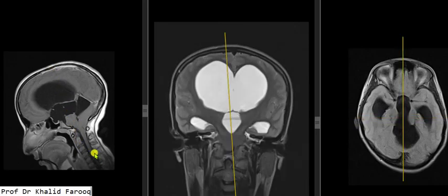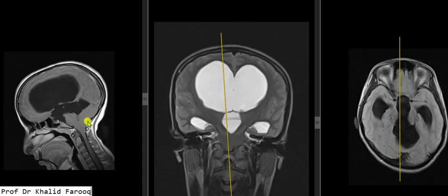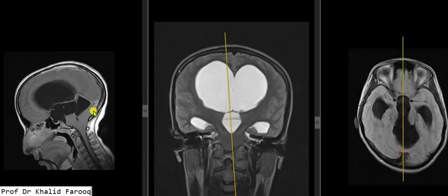We have placed it in Arnold Chiari malformation, considering herniated brainstem and cerebellar tonsil, including lower portion of the fourth ventricle, and syringomyelia formation in cervical cord. But there is another associated anomaly in the shape of arachnoid cyst, which made it more complicated.